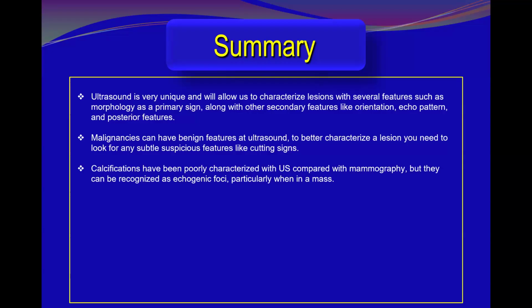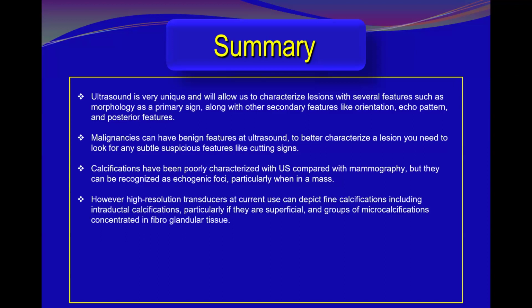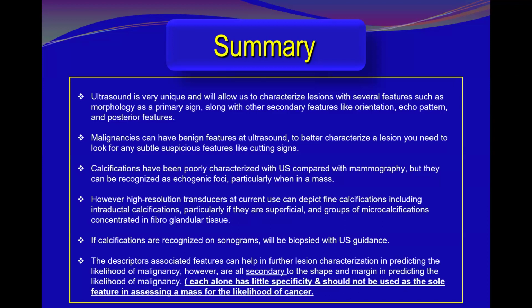Calcifications have been poorly characterized with ultrasound compared with mammography, but they can be recognized as echogenic foci, particularly when in a hypoechoic mass. However, high-resolution transducers in current use can depict fine calcifications, including intraductal calcifications, particularly if they are superficial, and groups of microcalcifications concentrated in fibroglandular tissue. If calcifications are recognized on sonogram, they will be biopsied with ultrasound guidance.